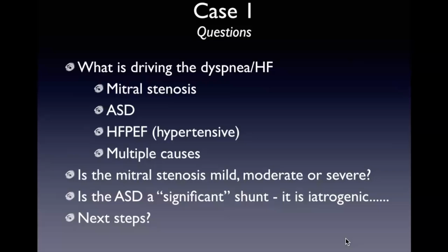Yeah. But I think one thing that would be helpful is to understand the progression of what happened. She's clearly had mitral stenosis before. Is the RV dilating more so than we would expect? Is it as a result of an ASD? Yeah. I think those are questions that I have in my mind. Right now, this is obviously not a straightforward case of rheumatic mitral stenosis because there are other factors involved, and that's kind of real life, right? These are complex patients.